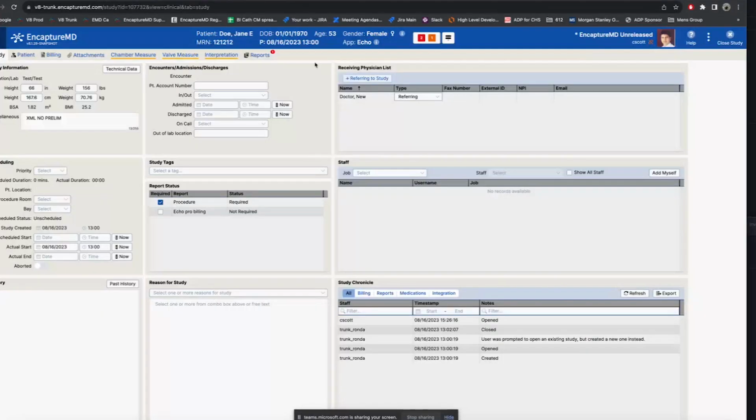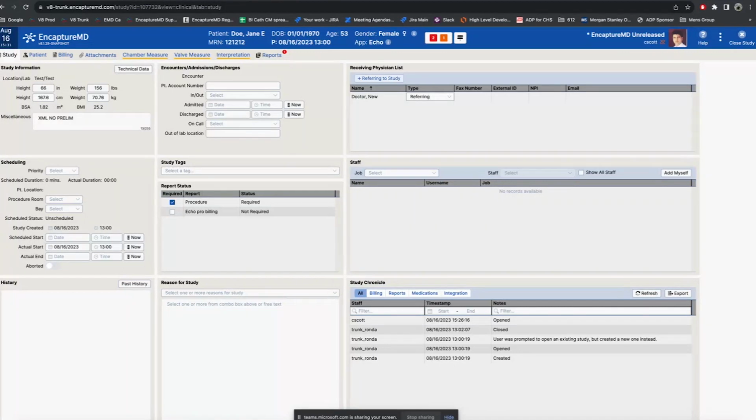Yes. All right, so I was going to start with an echocardiogram and just go through this at a high level. I'm going to assume that the crowd is a mixture of administrator folks and some clinical folks, just based on what we saw in the invites. But if I go too much one way or the other, just let me know in the comments.